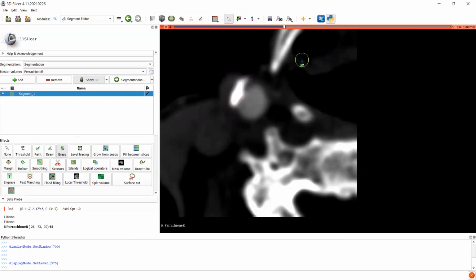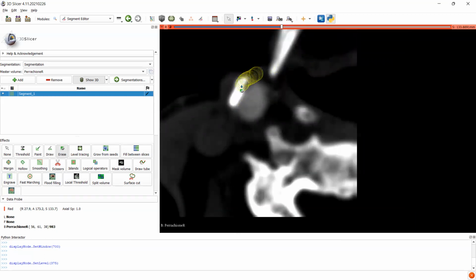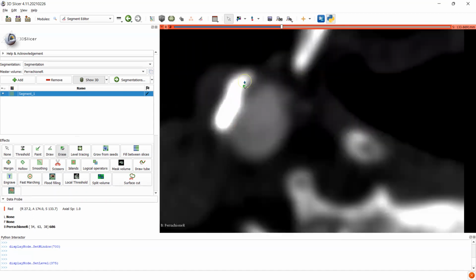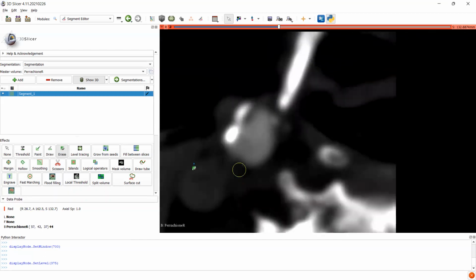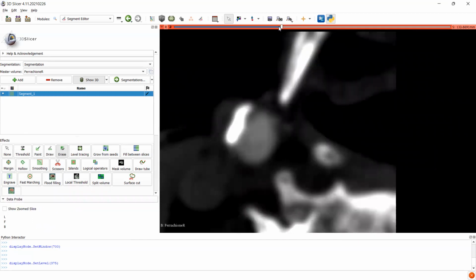But you just want to erase all this clotting. Clotting is lower values than it should be, and plaque is high values. So you see you've got clotting right here, you've got plaque right here. Actually got a little bit of clotting down here too. So for this, again, this is pretty easy so far. But I don't like these. That's pretty good. That's pretty accurate.